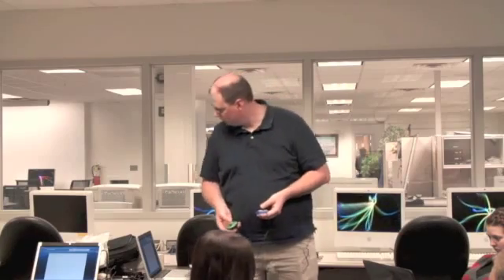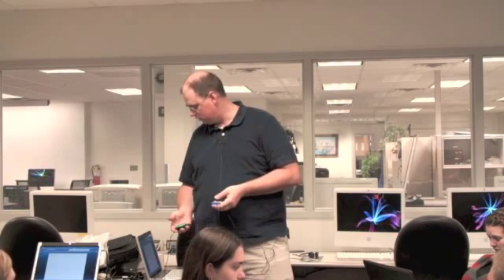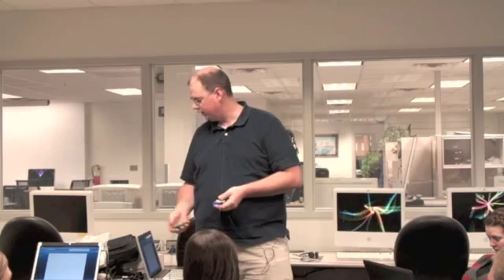E. One dash is going to be T. And your vowels are going to be shorter codes, like dot dash or dash dot. SOS is dot dot dot, dash dash dash, dot dot dot. With this, I can actually access every key on the keyboard. So there's an E, there's a T, where's my C, and then my space. And I just typed etc.